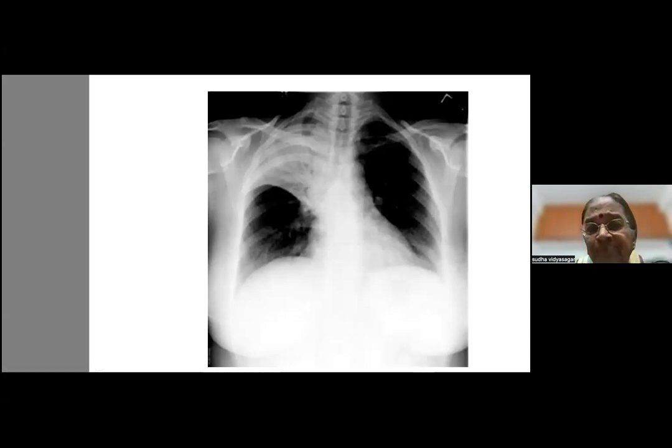Fine, what is that? That one. Mass lesion, okay? Right upper lobe collapse. Right upper lobe collapse. Everybody is saying collapse. Left inhomogeneous opacity. Right middle lobe consolidation. Okay, fibrosis. Have we left out any pathology? That's what I'm trying to think. Okay, fine. Let's again describe it.